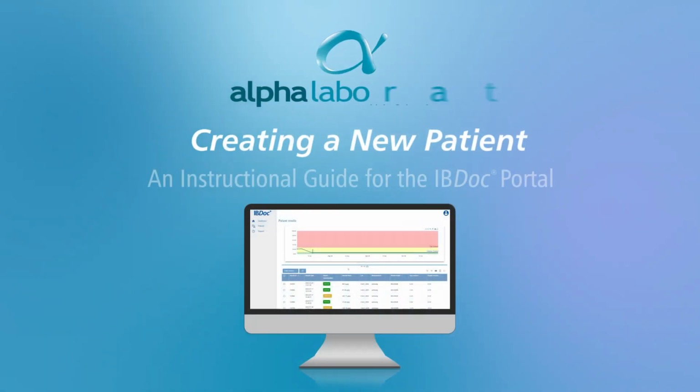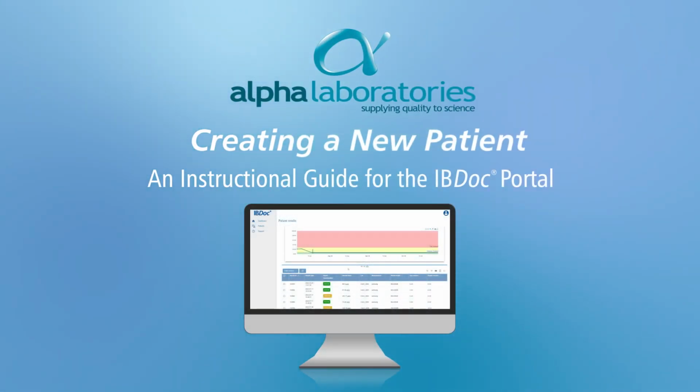Welcome! This video is an instructional guide for the IBDoc Portal. In this video, we guide you through creating a new patient.